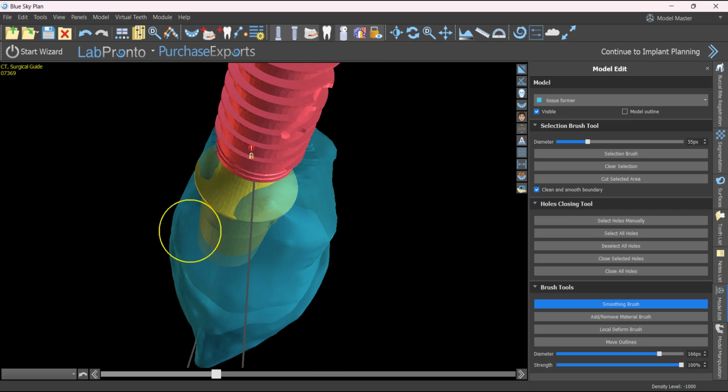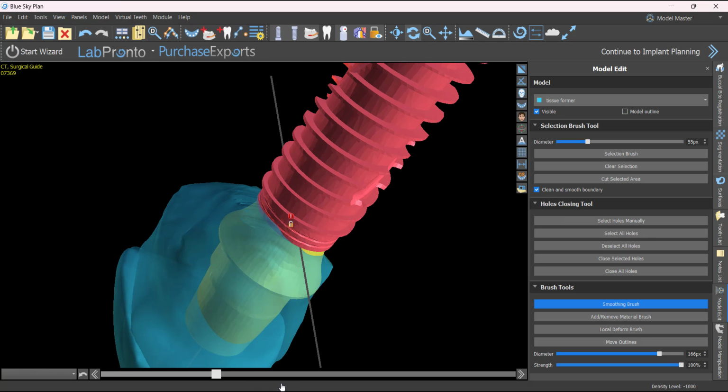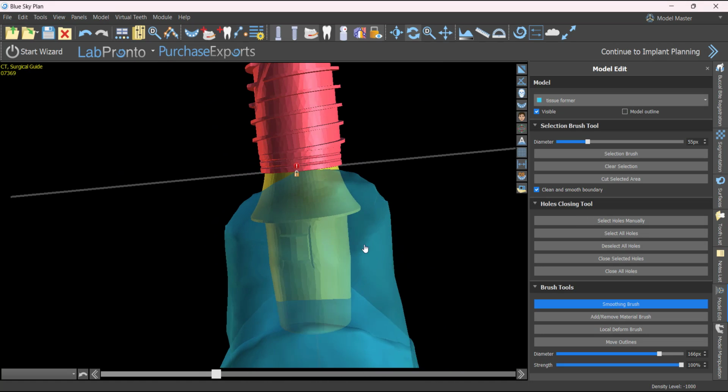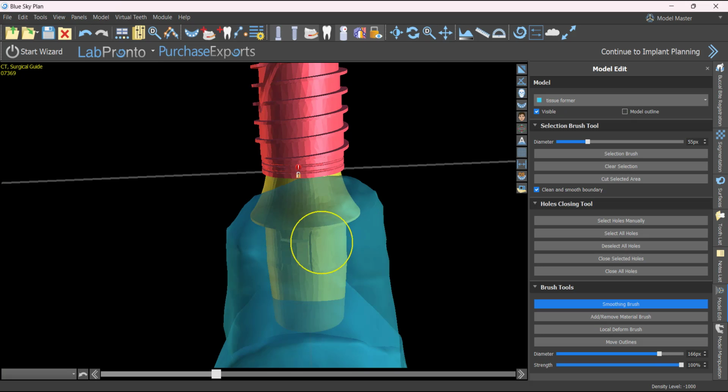So you can see when you've cut on a surface, that smoothing tool is very aggressive, and that's why I think it's better to not have cut all the way to the platform of the tie base right off the bat. All right, and now just with the transparency on, you can start to see here where you need to taper this thing back.